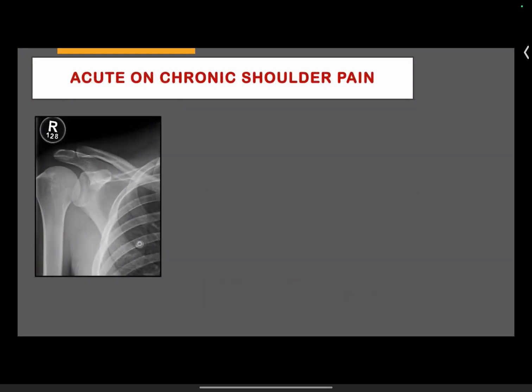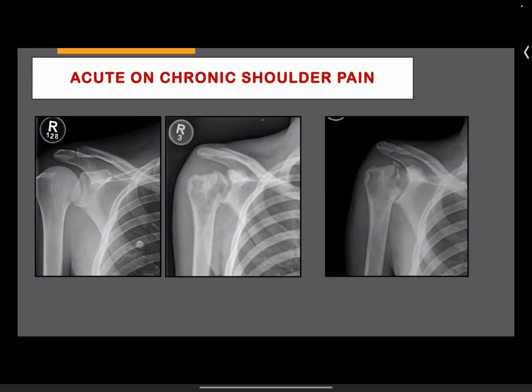I mean, X-rays are very useful, but I think it's a good habit that if you're reporting an MR, see if there is any previous X-ray or their previous series of X-rays, even better. So this is a young patient. They were acute on chronic shoulder pain. Okay? So if I put them there, like these are just over about 18 months subsequently.